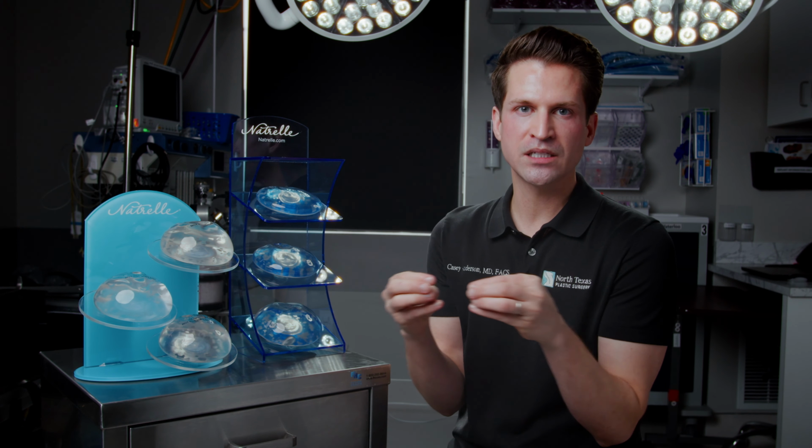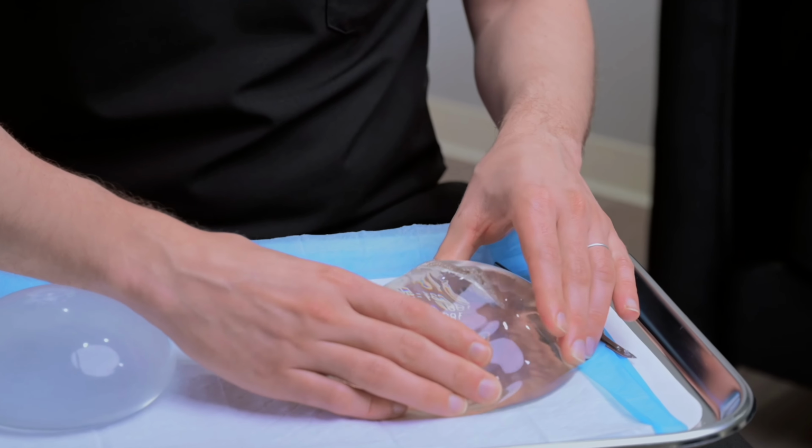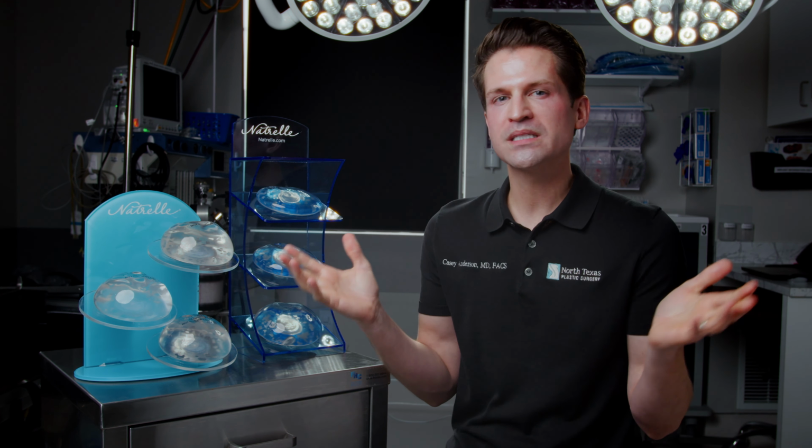All right, let's spend a little bit of time talking about the other aspect of implants that patients often find confusing, and that is cohesivity of the implant. So pretty much every implant that you're going to see these days, if it's silicone, is what's called a gummy bear implant. What that means is if you cut that implant straight down the middle, the gel inside doesn't ooze out. It's what's called form stable. It just holds its shape. That being said, with our Allergan Natrelle implants, there are 3 different thicknesses or firmnesses of the gel that's on the inside of that implant. What does that mean though?